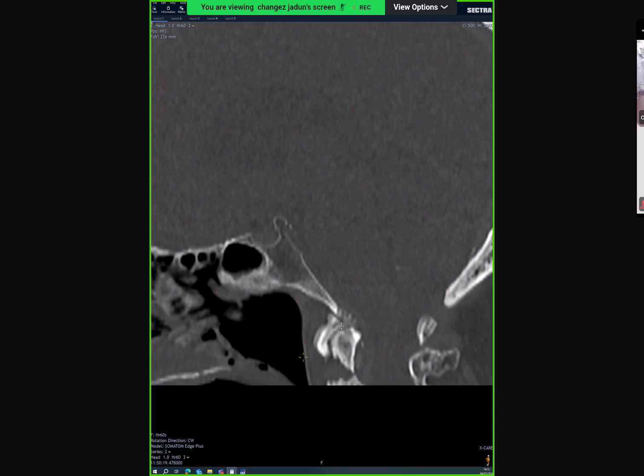These are important things. So you go through a system: front of the bones, middle of the bones, back of the bones, or vice versa, whichever way you want, but do not miss the base of the skull, because that's where you miss major fractures.